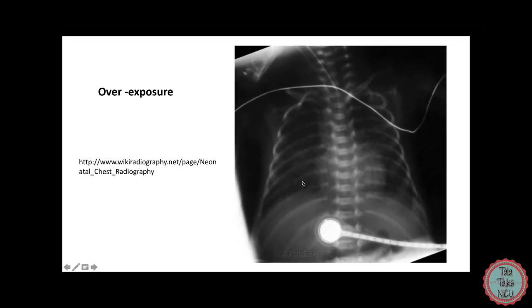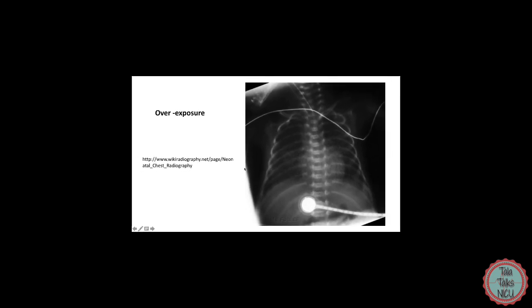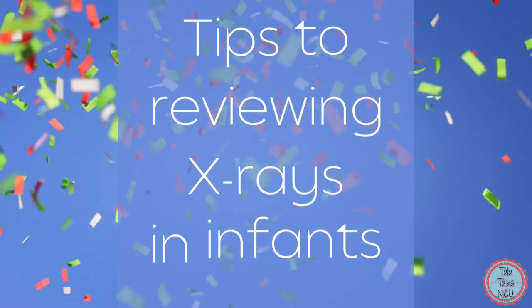As you can see, it's really hard to see all the boundaries in this X-ray, and everything looks like this could be just a pneumothorax.